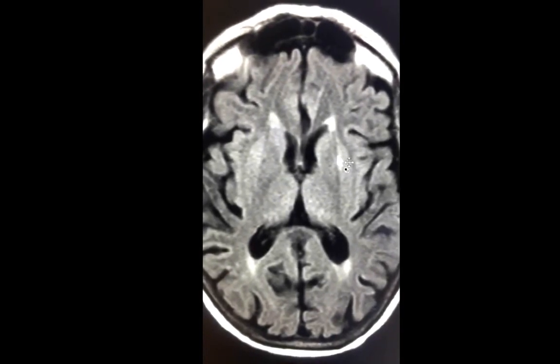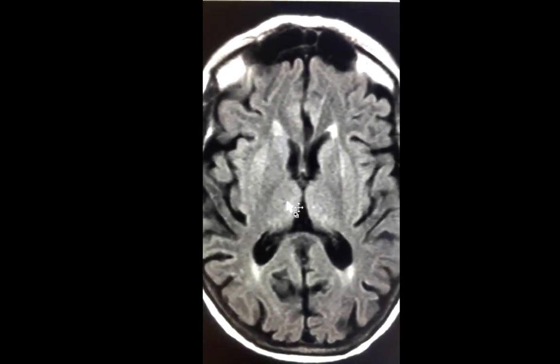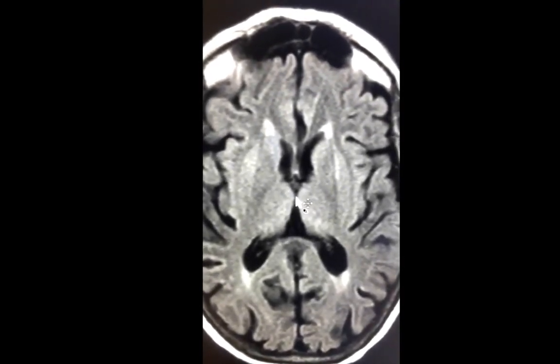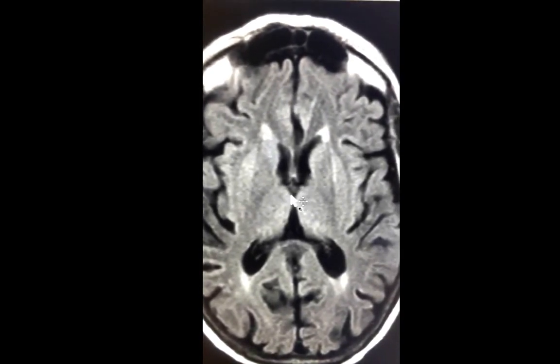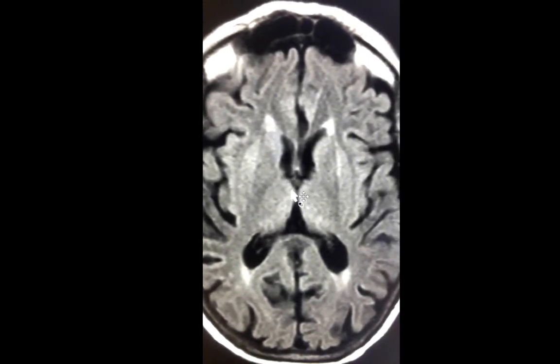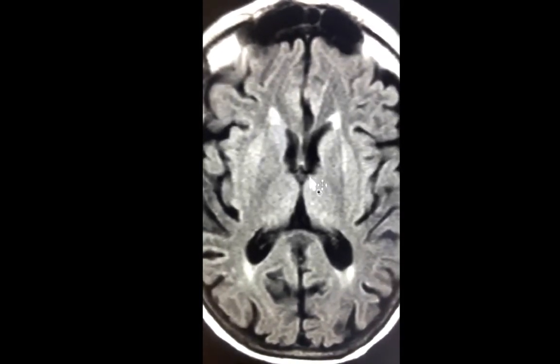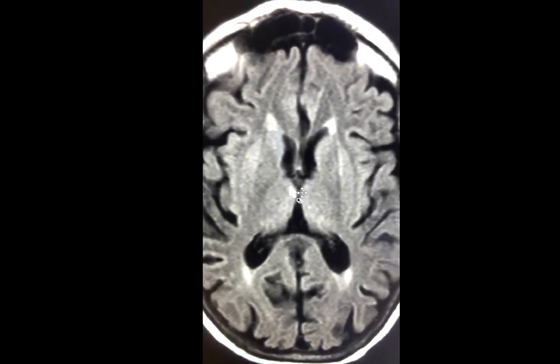So for the seniors, I'm showing the MRI on the same patient to highlight a very important point. Although a small colloid cyst is an important finding to detect, it might be very difficult to see on an MRI acquisition. It's not an abnormality that jumps at your face when you look at an MR unless you look carefully at the midline structures. And it might be confusing since we know that you could have CSF flow artifacts in such locations.